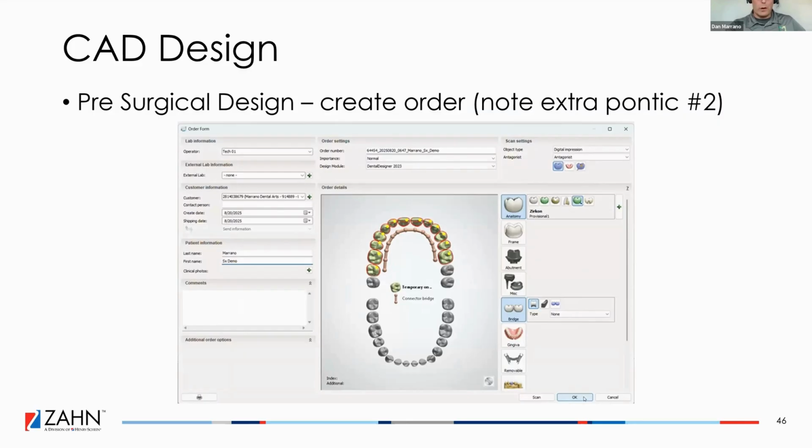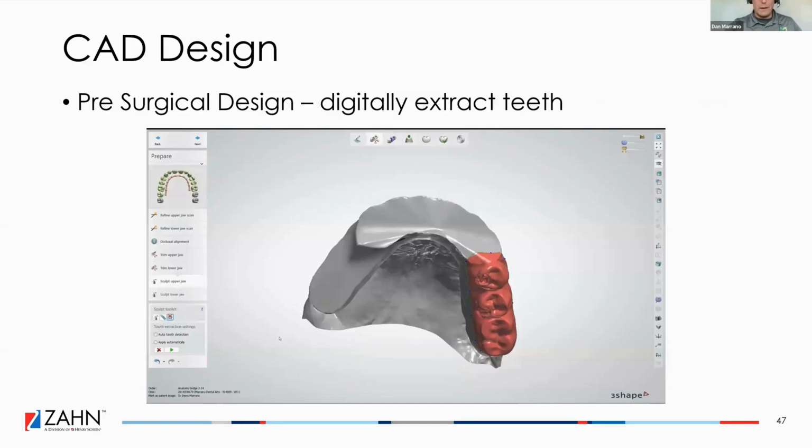The extra molar is for our Easy Gum, not the pink Easy Gum that you get from Harvest. This is OutCAD Easy Gum. It's a design that you can add into 3Shape so that we can add tissue without actually adding a gingiva step. So we bridge that.